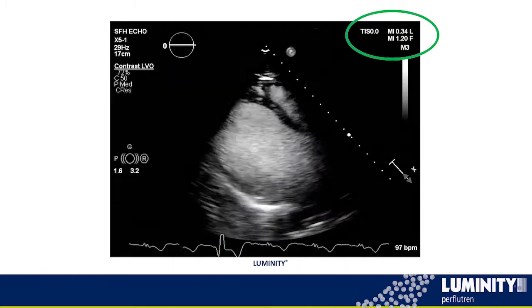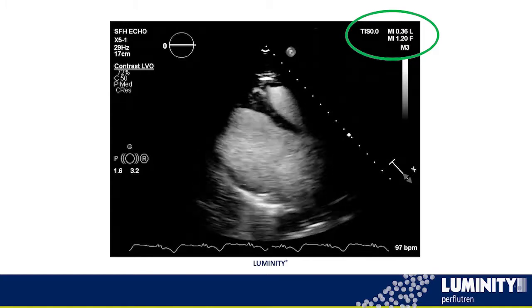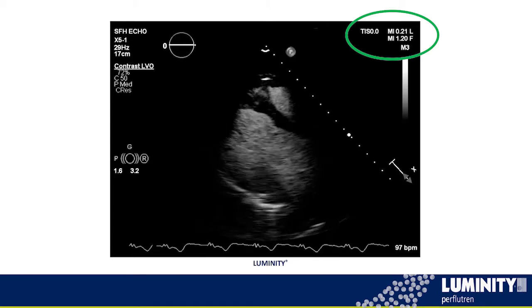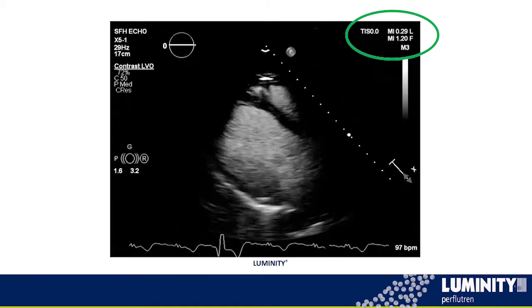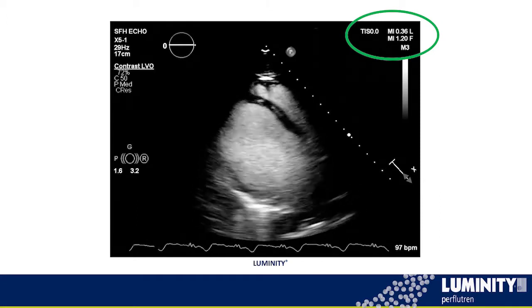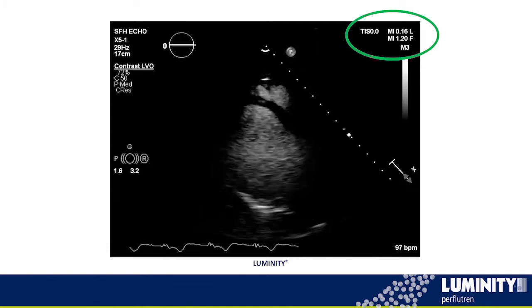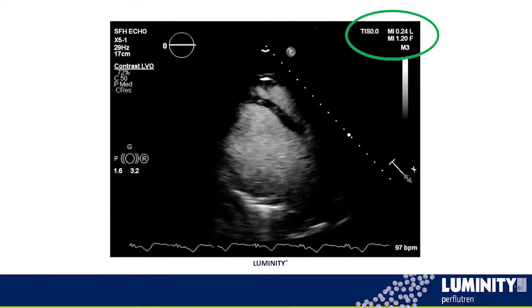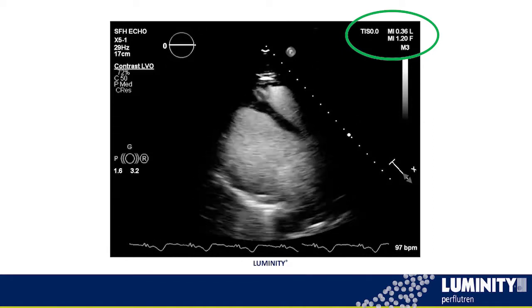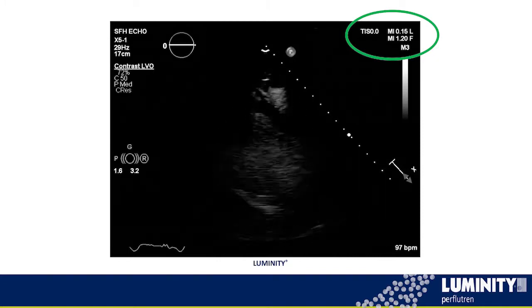If you think about a parasternal long axis view, right? So for example, the inferior lateral wall here is the furthest away from the transducer. So often a good tip sometimes is to increase the MI, which makes sense. You think of those bubbles that are 15 centimeters away. If I hit them with the same power or MI as a bubble that's a couple centimeters away, it's probably not going to resonate or oscillate those bubbles. And that, again, is what causes that signal, which allows us to see the volumes, allows us to see the left ventricle.